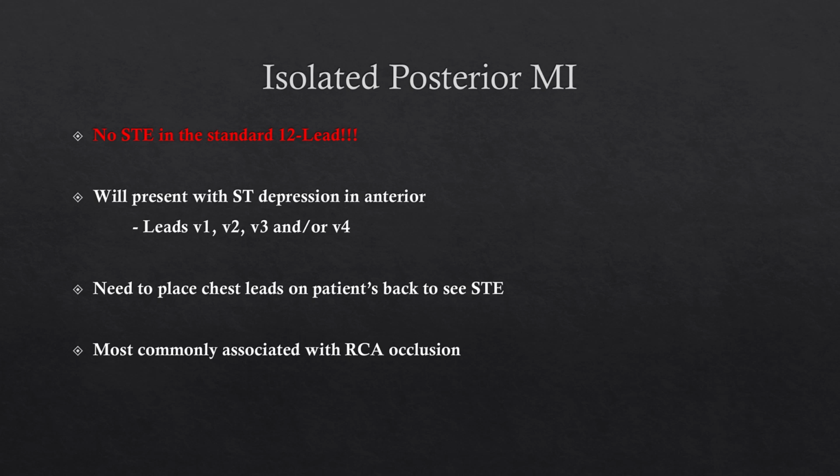If you have those things, you put some leads on the back, you have ST depression in the front, you have a patient that has the right physical exam presentation findings, you put some leads on the back, you see some ST elevation, bam, you caught yourself a posterior STEMI, and we can get that patient where they need to go and potentially save their life. There are some PCI facilities that will just allow you to activate on the anterior depression because of that concern for the isolated posterior. But we can improve that diagnostic by just putting some leads on the back.